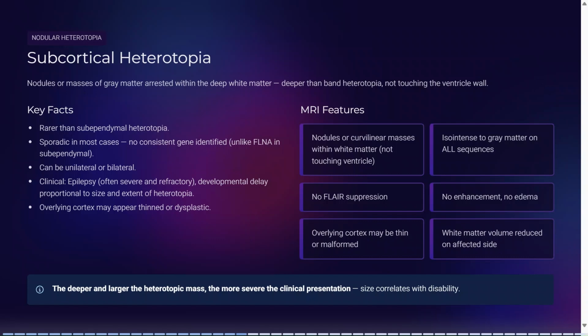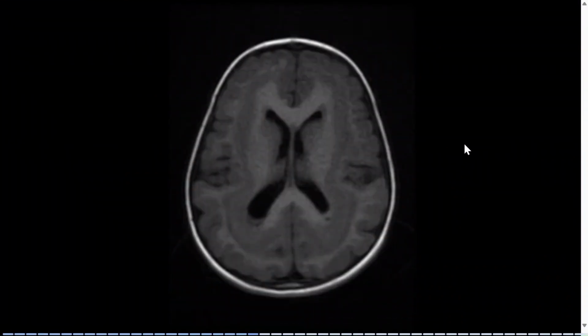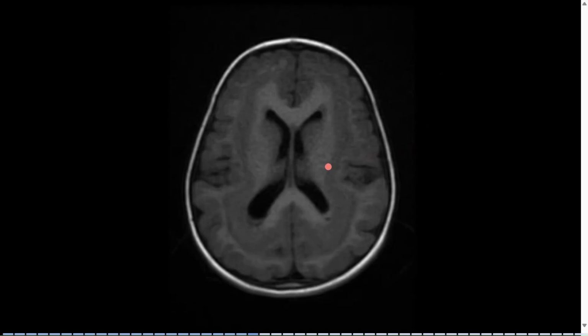This is pretty simple. In this image, we can see normal or near normal cortex, but beneath that there is a similar signal band seen below the normal cortex, and this is visible here. In this one, a whole band is seen along almost the whole cortical surface. So what is it? This is known as double cortex.